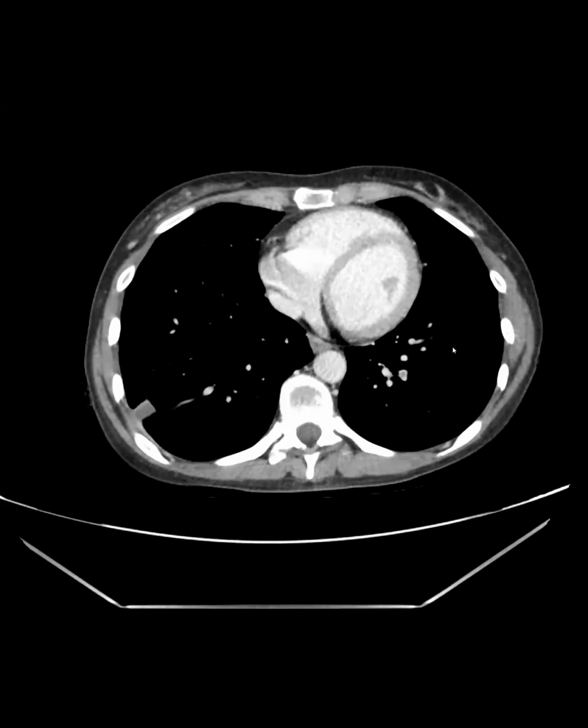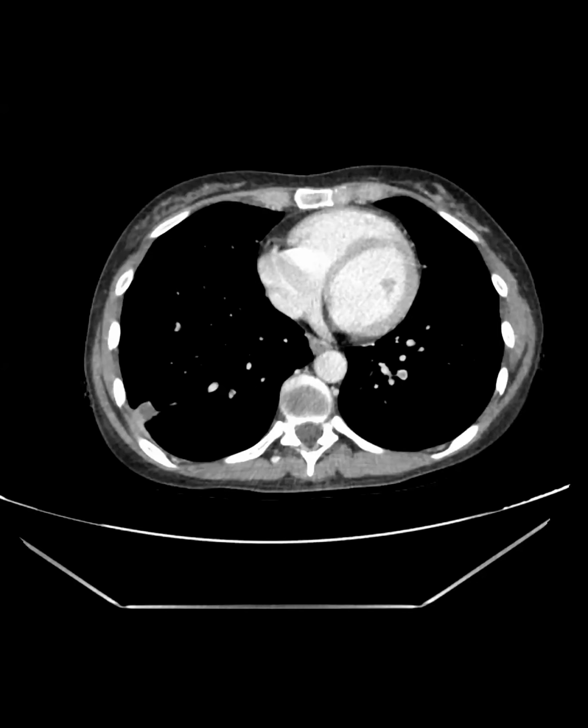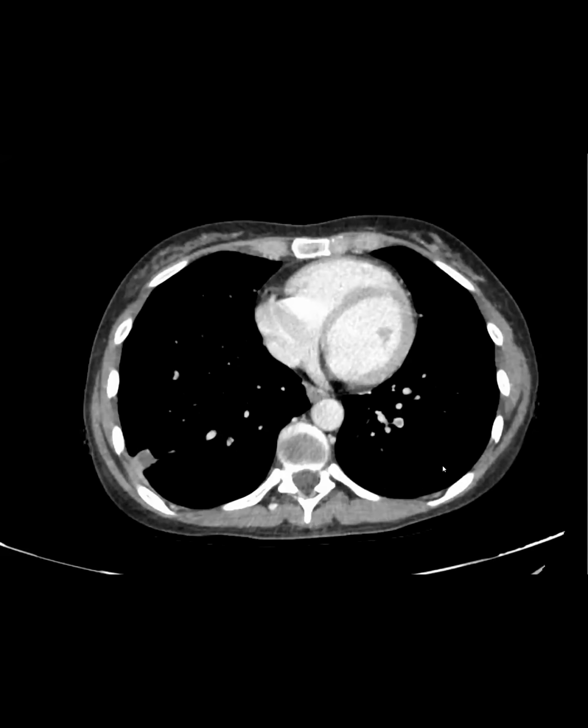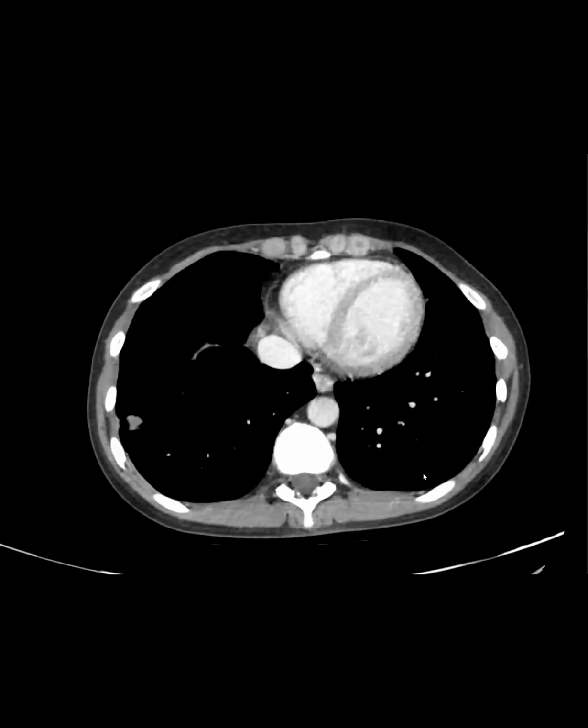Okay, this is my next case. So there's already some findings here.